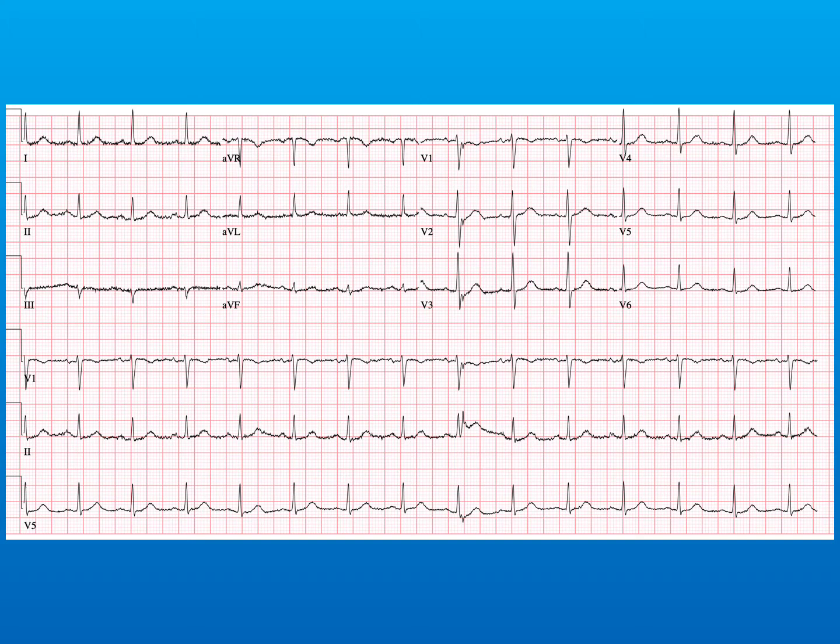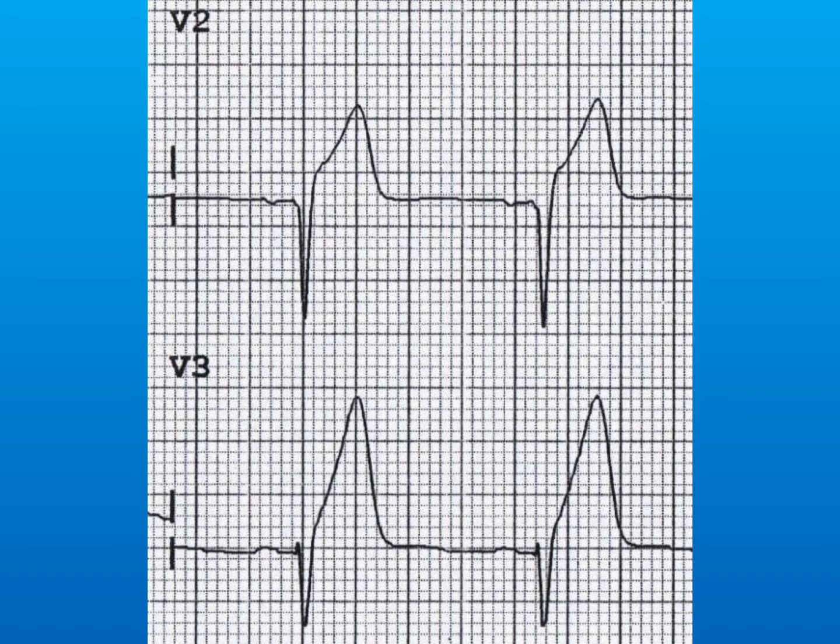Whereas in the case of a hyperacute T wave, you can see here that this T wave is pretty large compared to the QRS. It doesn't necessarily have to be tall, but it does have to have a wide base. You'll also typically see a loss of the asymmetry that we spoke about before.